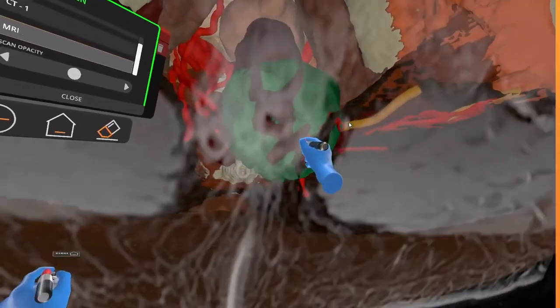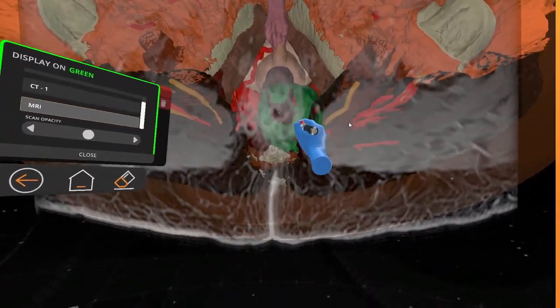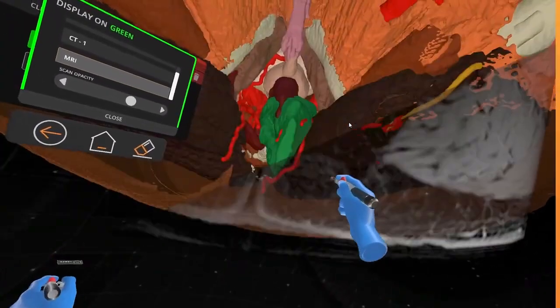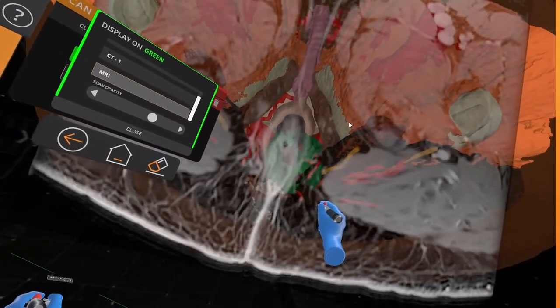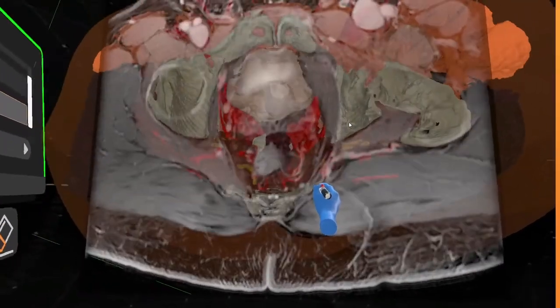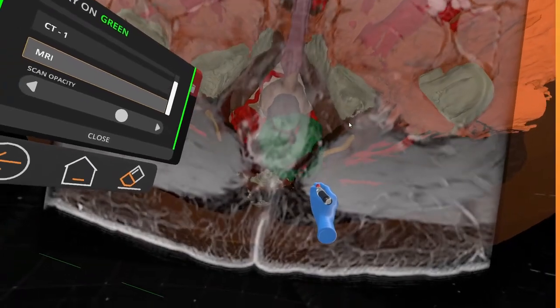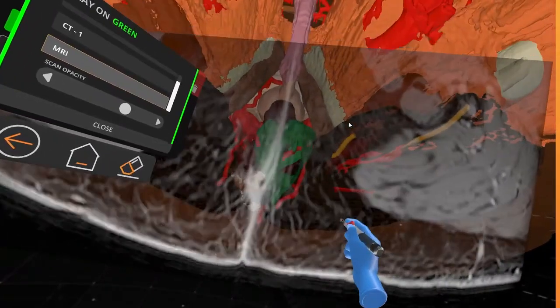The lesion can be seen exerting a mass effect on the mesorectal fat. The mass extends through the pubococcygeus muscle anteriorly, involving the posterior anal canal. The internal and external sphincters are disrupted posteriorly. By combining cross-sectional imaging with a three-dimensional model, a more complete understanding of structural relationships is obtained.